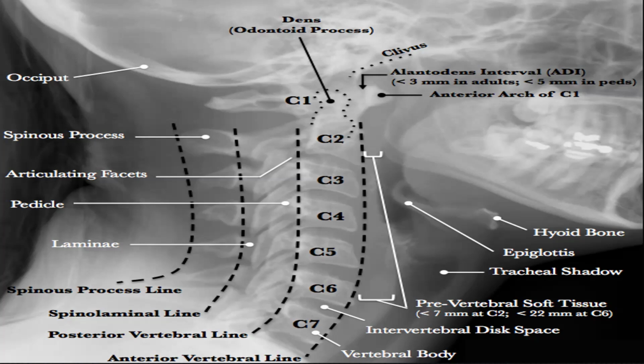And the cortical corners. Four corners, right? Yes, sir. So in each vertebral body, we will check the height: anterior, posterior, and center. And the shape should be quadrangle or rectangle. And four cortical corners. So if all have the same shape and same height, it means normal.